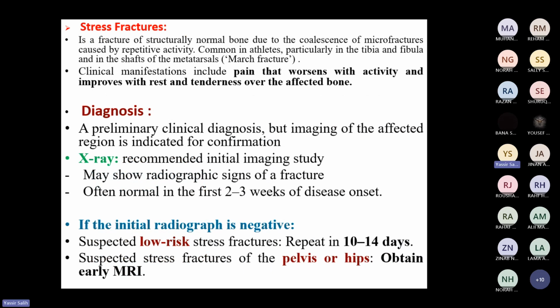كنا اتكلمنا على signs of fracture. Please put these signs always in your mind when you are looking at a patient presenting with trauma. يعني sometimes the fracture may be very obvious, very clear. دي ما في مشكلة. لكن if the fracture is subtle, these signs help you in identifying the fracture. Lucent line, dense line, step in the cortex, alteration of normal articulation, soft tissue swelling, and joint effusion. Joint effusion sign is displacement of the fat pad, ما positive fat pad sign.